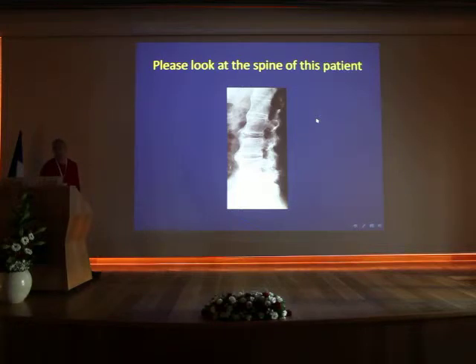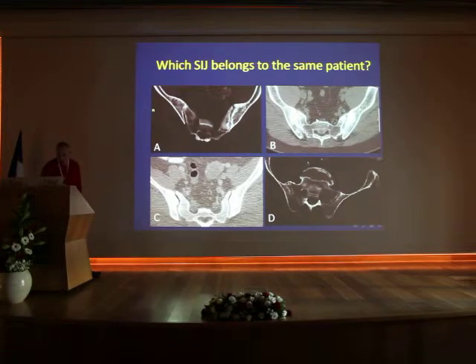Think what your diagnosis is, and say which is probably the most reasonable diagnosis. What do you see in A? In A you can see erosions in this side and irregularity, some almost ankylosing here in the anterior part of the right side.